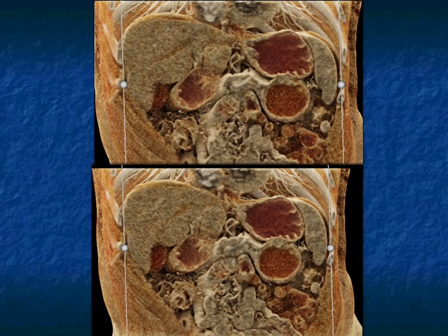So when you start getting cystic lesions, even when they're a bit larger, they have nodularity, wall enhancement, and usually the enhancement is 360. You've got to be thinking about neuroendocrine tumors.